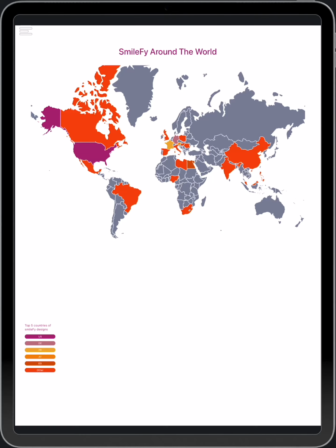Today's tutorial, creating a digital wax-up with SmileFy's latest workflows. Welcome to today's tutorial. We'll guide you through the process of creating a digital wax-up using SmileFy's latest automated workflows and technologies. By the end of this session, you'll be able to produce a printable smile design during the first patient appointment, streamlining your workflow and enhancing patient satisfaction.